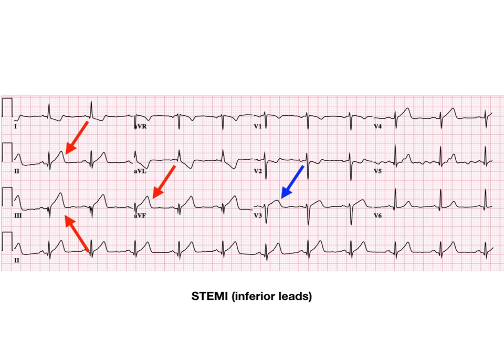Now, if you look at this ECG, I want you to theoretically ask yourself, what would have happened if you went through this with that dumb, methodical approach that they teach you in medical school? Well, rate, rhythm, what do I see? Axis, well, let's see, 1 is upright and AVF is upright, so the axis is normal. Where does that get you in this question? It gets you absolutely nowhere.